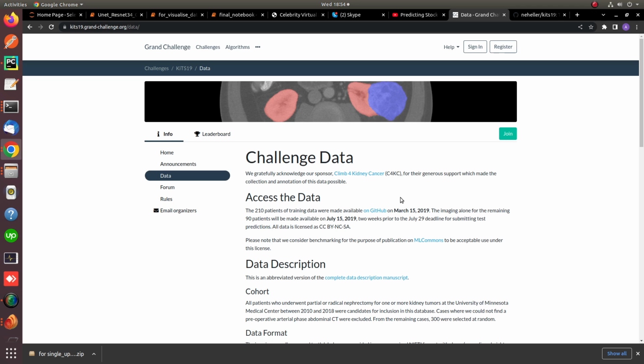So, one of the major improvements seen so far in terms of medical datasets is that the diagnosis of tumors can be done much more efficiently than by humans. With this improvement in mind, recently in 2019, the KiTS dataset was also made publicly available. So when I encountered this dataset, I thought I should create a video about it.